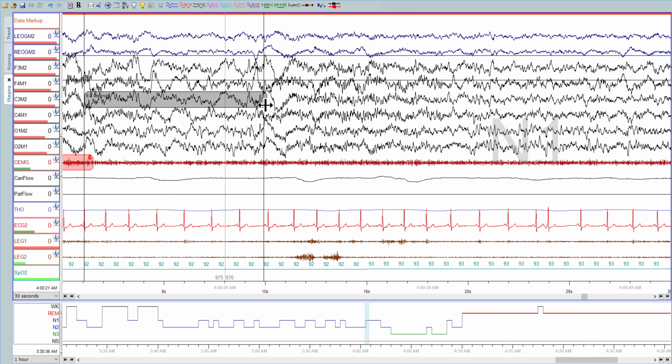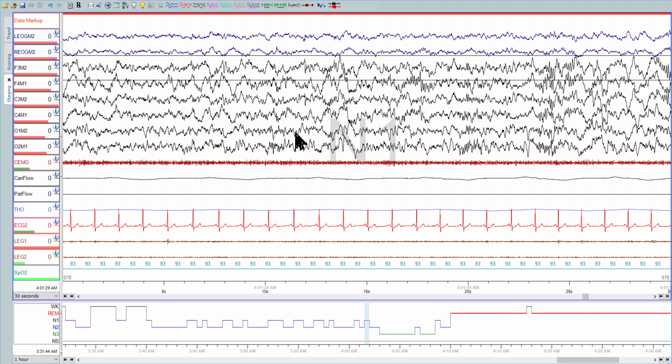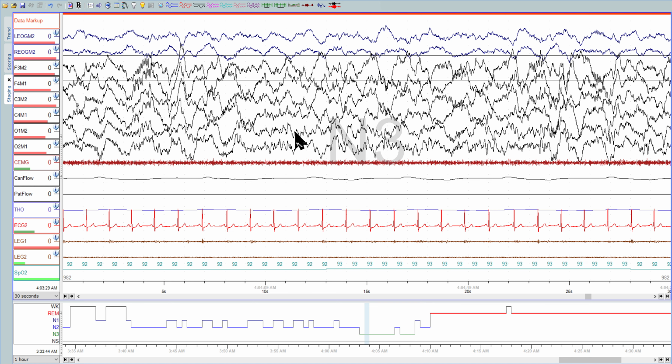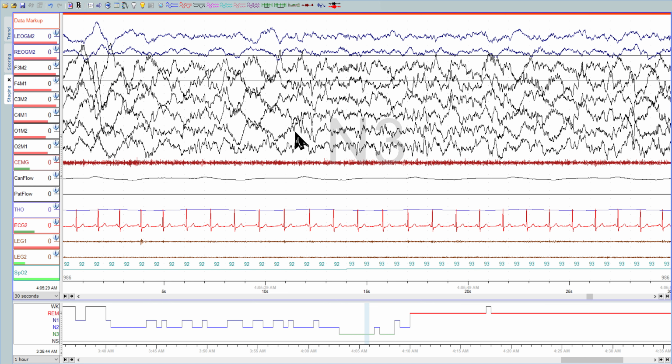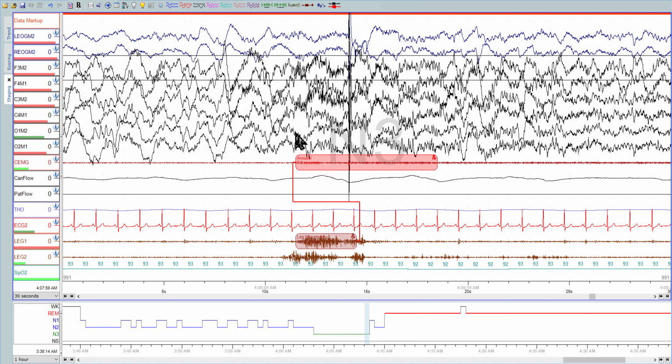Not 10 seconds, eh? Nope. 1, good. And I think this is even a K complex. It goes above and below baseline. Into 3. I'm going to keep that one as 3. Nothing really changed. And this one I just changed to, actually, yeah, keep it in 3.